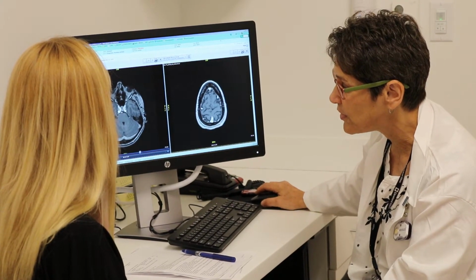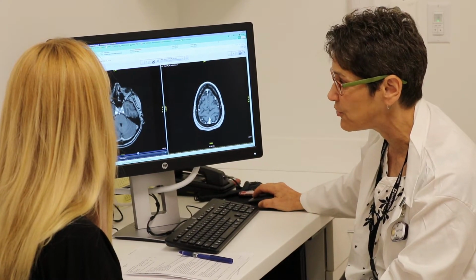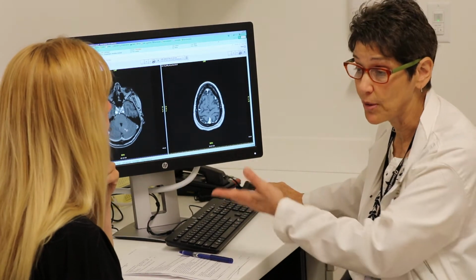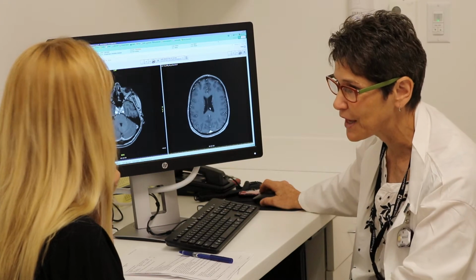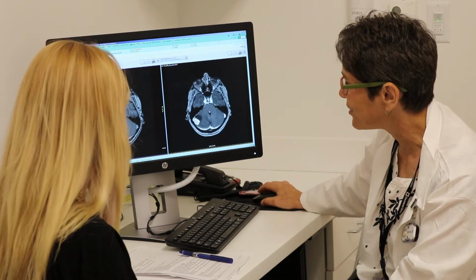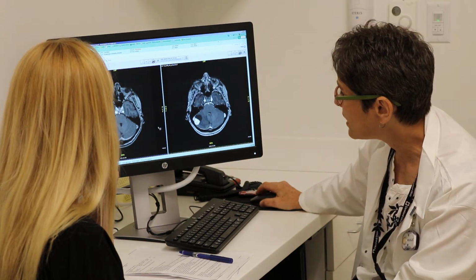And then you start to see this is the right cerebellar cyst, the larger of the two, with the lesion behind it, which is not uncommon with the hemangioblastomas. They have the cystic component. I don't know why I feel like I'm saying it for the camera, even though you know more about this than anything else, but they just kind of reiterate that. Sure. And then, let's see if we can line this up.